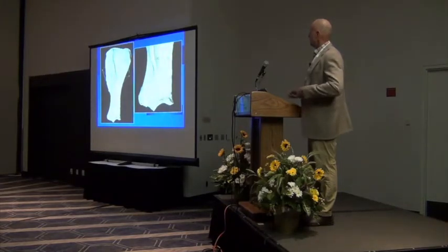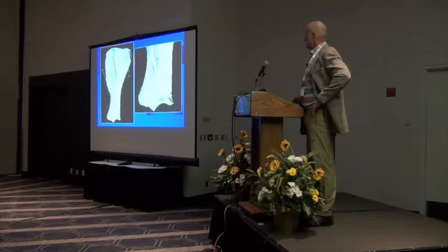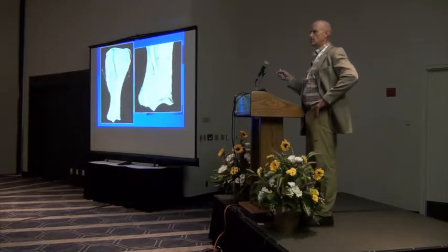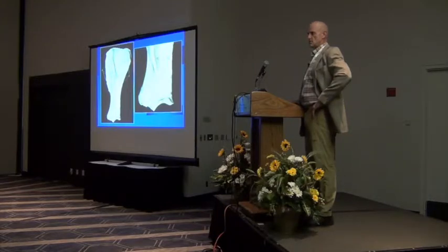And then we've got the scapula. With the neck of the scapula that comes down, we've got the supraglenoid tubercle, and you know, this is an area of weakness. And then I think I have a few cases, that's an area of protuberance that sticks out, and the spine of the scapula frequently develops sequestrums. So I want to show you a couple of little tricks to think about when you're looking for sequestrums in the scapula.